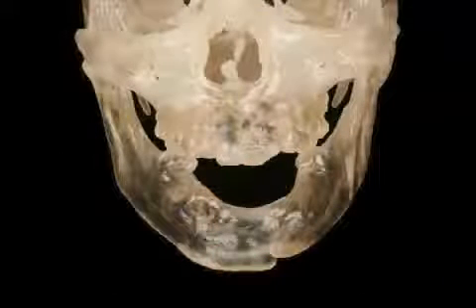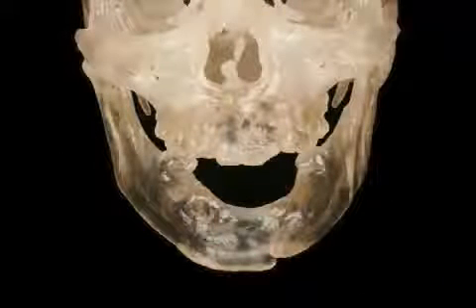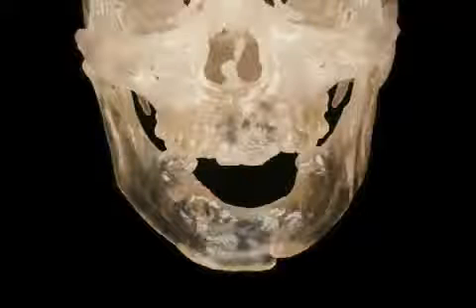You can imagine the process much like a printer, except that with stereolithography, the material is printed in 3 rather than 2 dimensions. Here you see a stereolithographic model of a lower jaw. The information used to create this model was obtained from CT data.